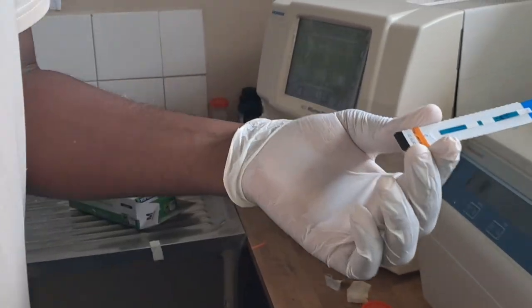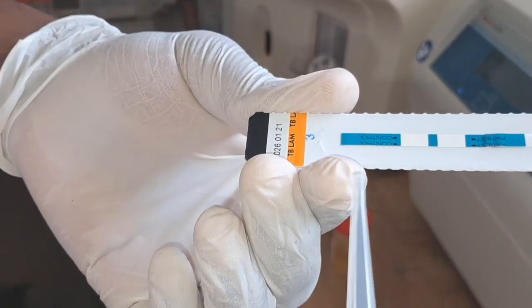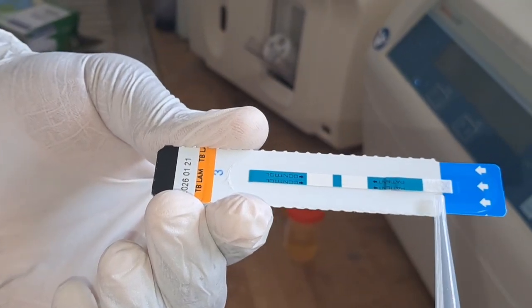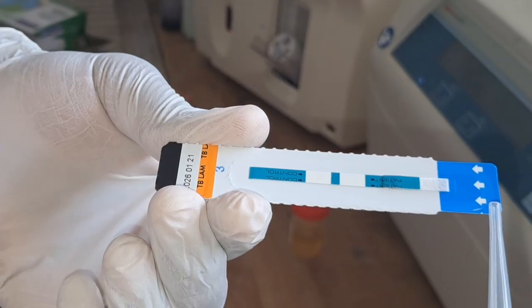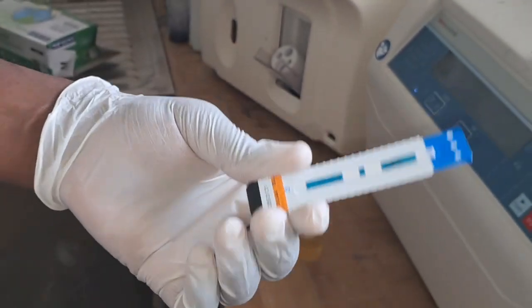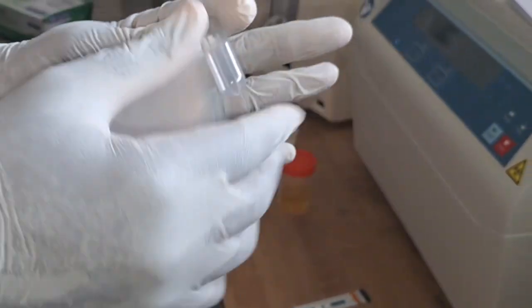So here is where we find the lines for control and the test, and this is where we put the sample. Have you seen these arrows? So we'll collect the sample. Have you seen me? I'm putting on gloves.